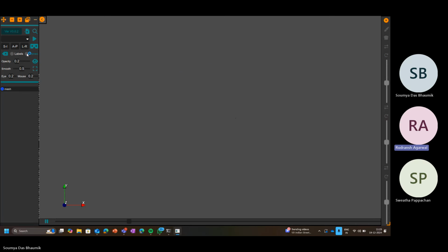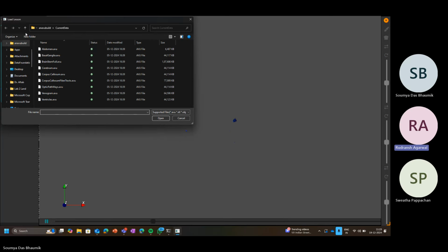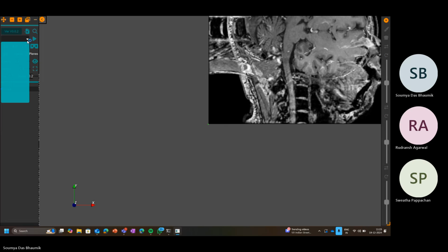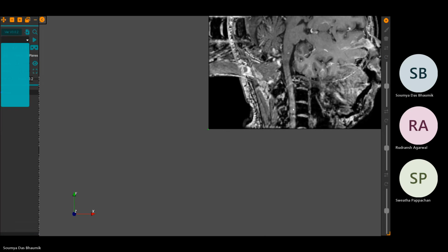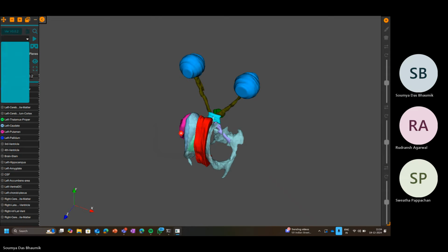Next, if you could load another lesson. Let us go to optic pathways, the third last one. Crashed. Okay, it's back.